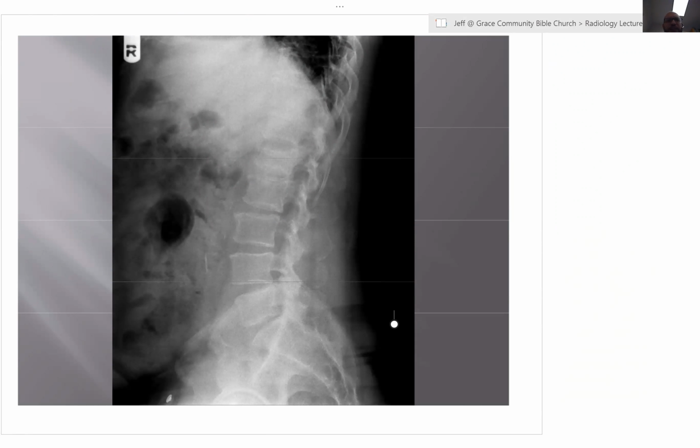Here's a sledding injury with pain in the thoracolumbar junction. And again, another compression fracture here. But on this compression fracture, you know, the bone looks pretty good, but you've got what's called a step sign at the anterior-superior corner. You've got increased sclerosis right underneath the end plate.